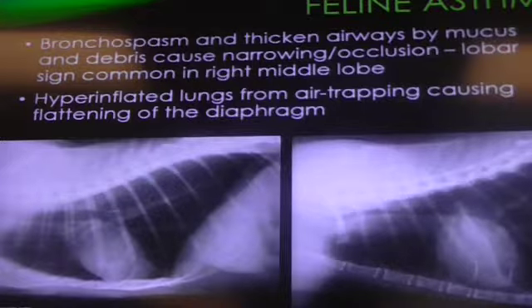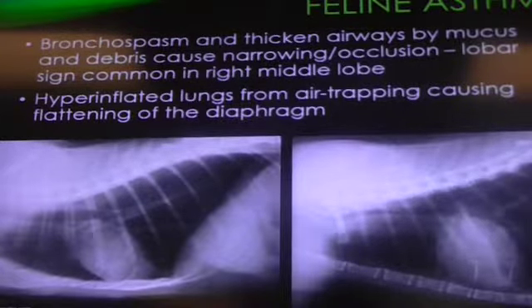The apex of the heart. Can you identify that? Alright, now I'm going to show it to you. So here it is. This shadow? No, down a little bit more. You have to tell me more specifically.